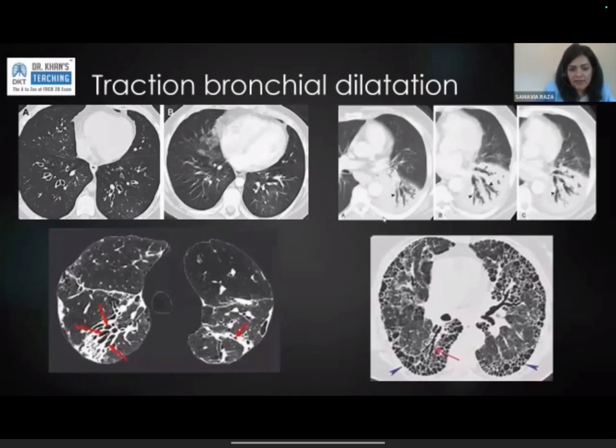Some of you have said bronchiectasis. I'm assuming you mean primary bronchiectasis. Neda has said air bronchogram in the context of consolidation, and that's absolutely right. This is consolidation, and this is the point I was trying to make. Sometimes you can see dilated bronchi in consolidation as well, and that presence of air bronchogram can immediately make you think, is this bronchus dilated or is this ILD?